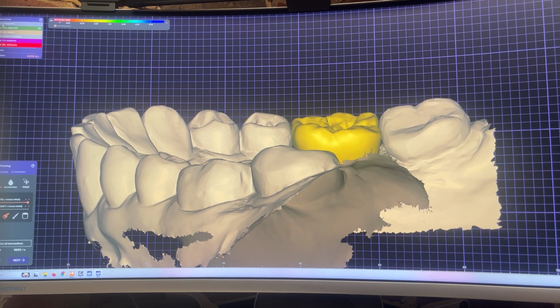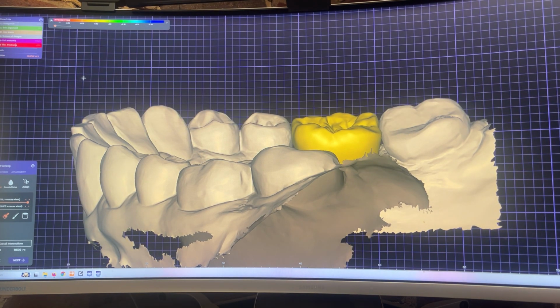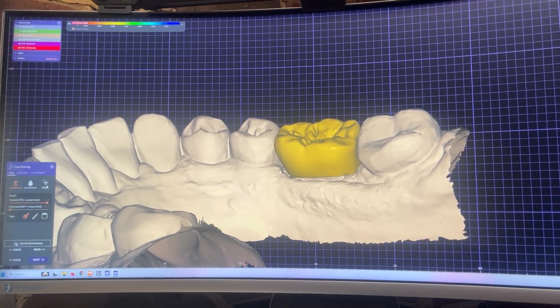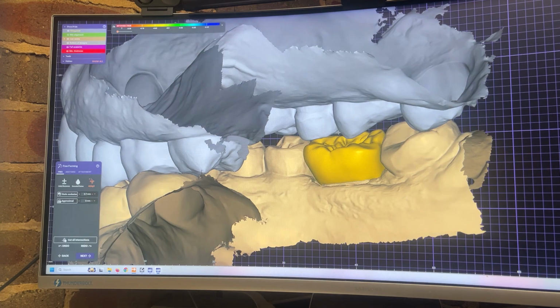You can check the bite. Like I said, check the bite. So you go to adapt on the side here. This is where you can change the bite. Scott likes it really open, 0.7, 0.8, sometimes 1 mil open. He just doesn't like interference. I think he's very conservative. He doesn't want the zirconia to break and crack. Just click on there and it'll do the bite for you. If you set it to 1 mil, it drops everything in contact down to 1 mil. It's really quick and easy.